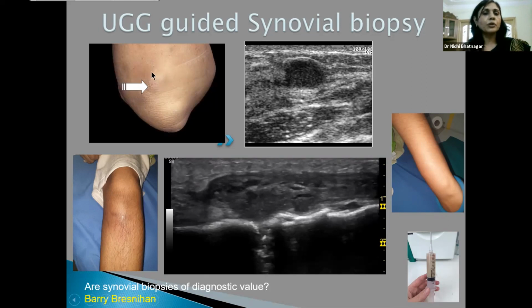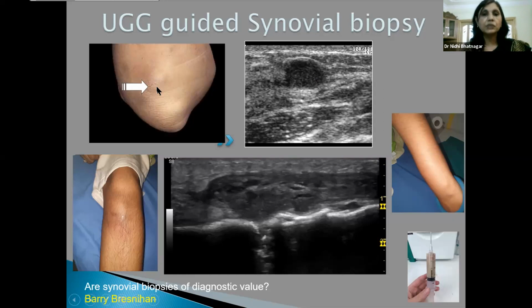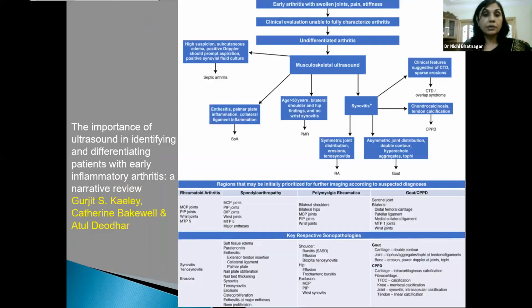When we're talking rheumatoid nodules, these are small nodules present in the subcutaneous region over the bony prominences. On ultrasound, they look like hypoechoic, well-defined masses, and they can undergo necrosis. They can become infected, like in this particular case, but they don't have calcification. So every time you come across nodules such as this, do try and think out of the box, and not go the closest way, which we tend to do in India.